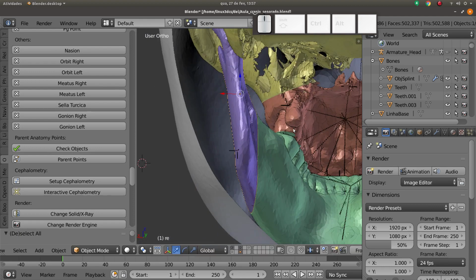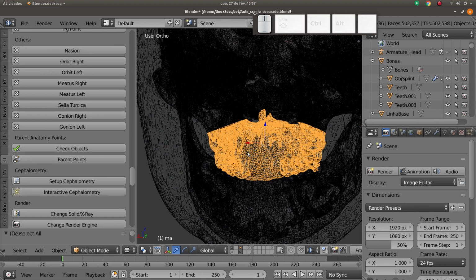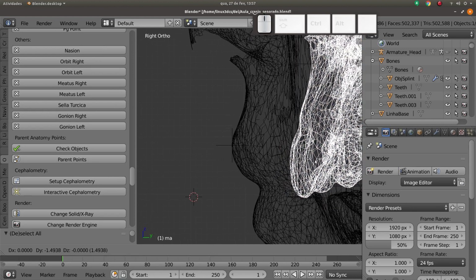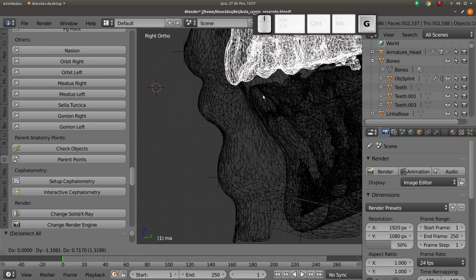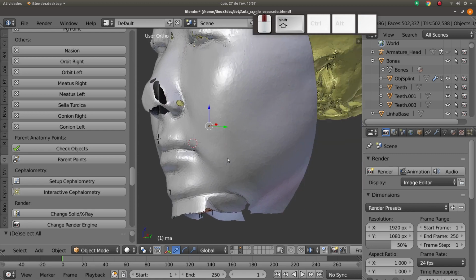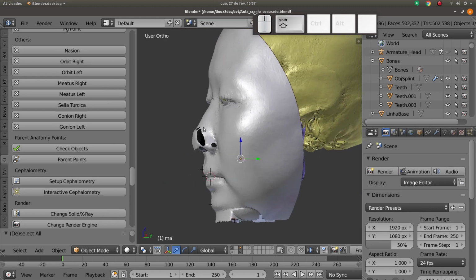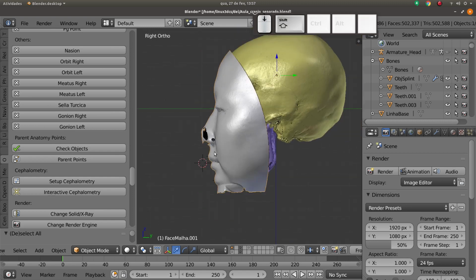The same thing will happen, or I imagine that will happen, when I select this maxilla object. This point is going to move together. When I move the maxilla, look, the point moves together, and the down point doesn't move. Some move because they have some influence, but only the objects over the bone or the soft tissue move, like here.